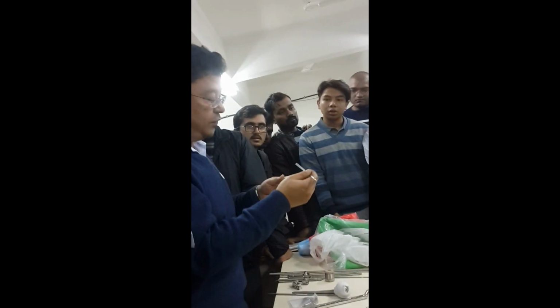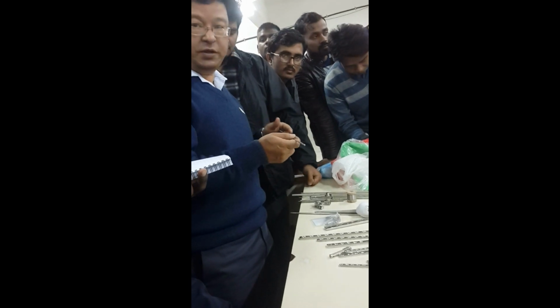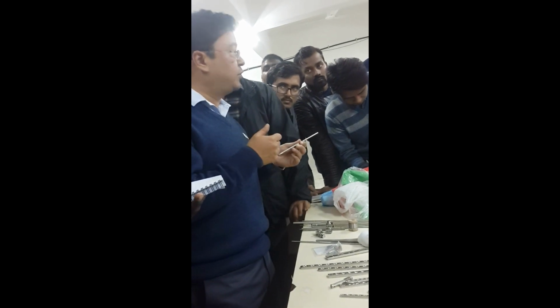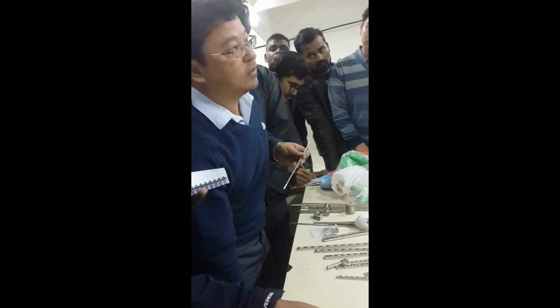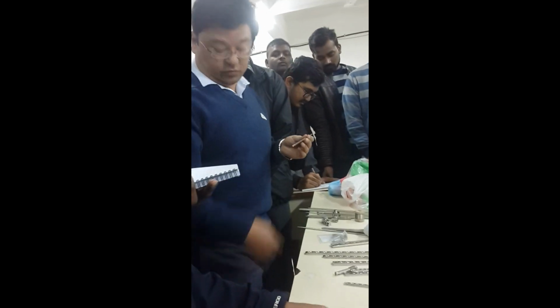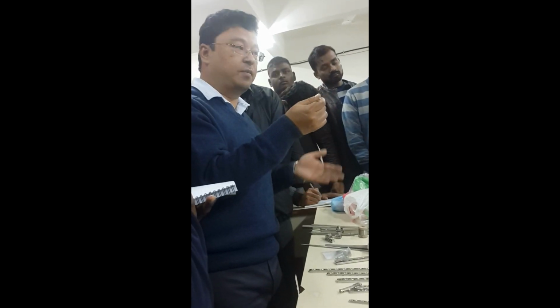Distal femur. So, if you look at the femur, you go from medial to lateral. Calcaneum also medial to lateral. But for tibial skeletal traction, it is lateral to medial. Why is that? Because we have control of the entry point, we don't have control of the exit point. So when you apply tibial skeletal traction, you always have to keep in mind the common peroneal nerve. That's why entry is from lateral to medial. Others are from medial to lateral.